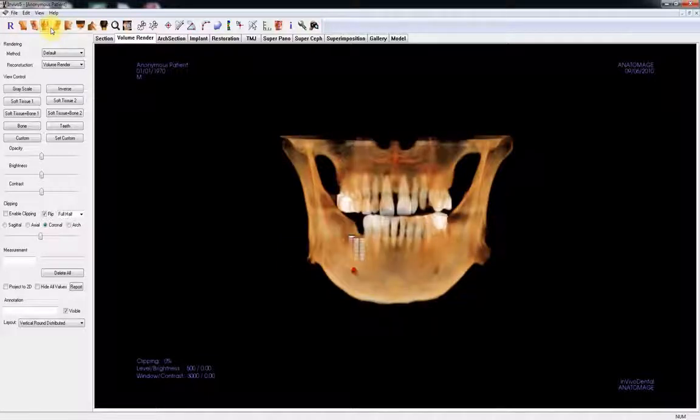These modifications will be applied to all the views with the 3D volume throughout the Invivo tabs. All sculpting can be undone by clicking Edit, Undo.